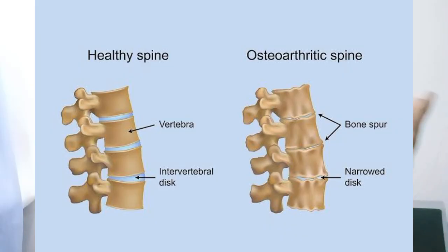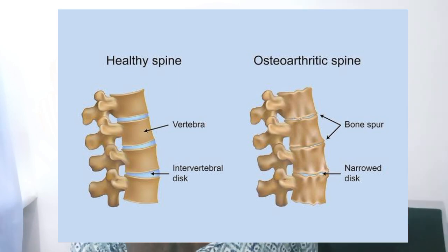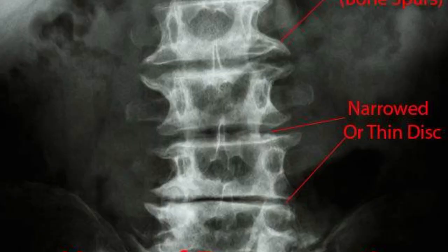Now let me show you an example of what a normal vertebrae looks like. Now this picture, you can see that this one is normal. This is the way the back is supposed to look like. This is the way the spine is supposed to look like. Now we can see this particular one, there are reduced joint spaces there. There's spondylosis in this particular one. So that's how you know the difference between a reduced one, a normal one, and an abnormal one. Now let's go to the X-rays that I'll be showing you. I'm running you through three different X-rays for the back and two for the neck.